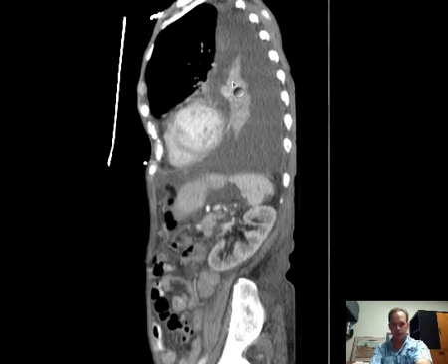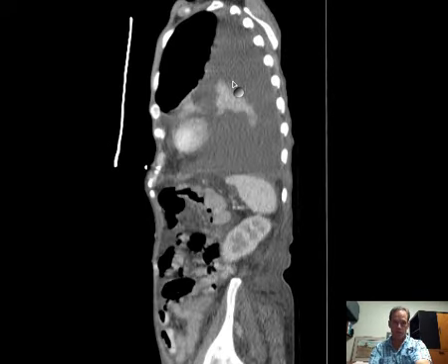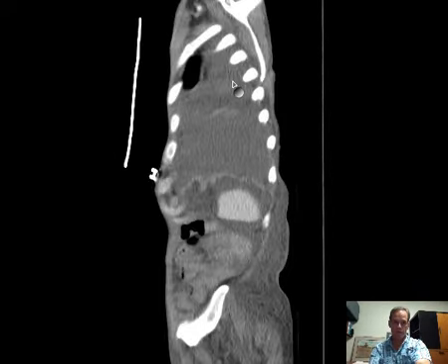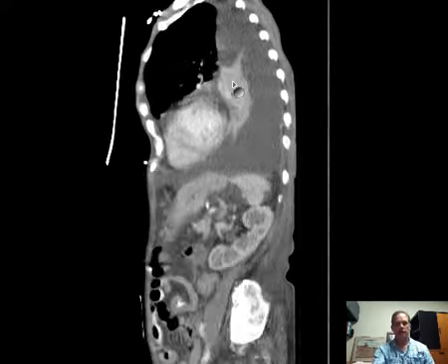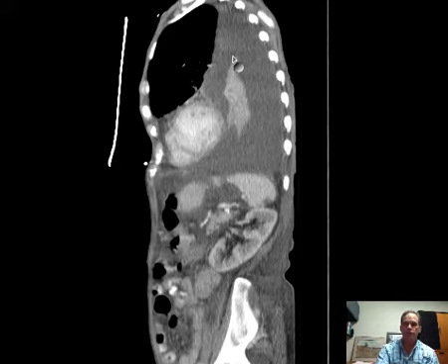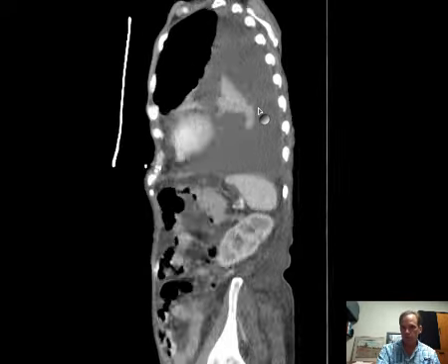Okay, what do you think this is? Left upper lobe, left lower lobe. Okay, so you see it in the sagittal. Well, here, remember again that, like on the right side, the major fissure on the left courses obliquely. That's a little bit of a different angle, but it's very similar. And so it's safe to assume that this is the left upper lobe, and this is the left lower lobe.